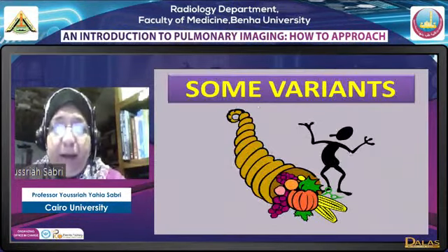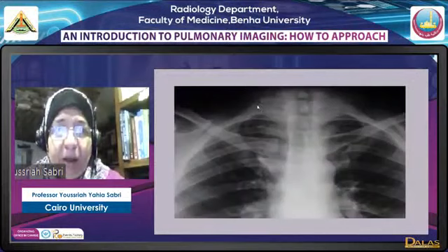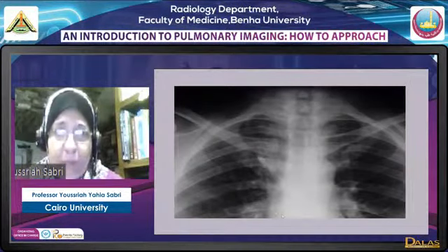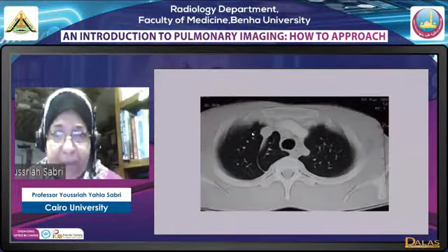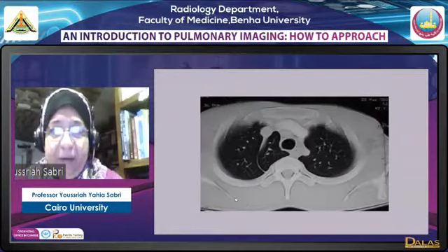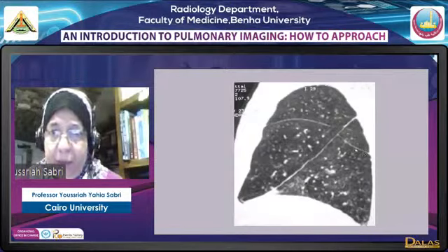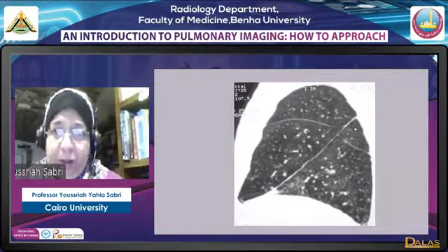بعد كده الفاريانت، ذا كومنست فاريانت اللي احنا بنلتقي بيه هو الازايجوس لوب فيشر زي ما حضراتكم بتشوفوه ده منظره في البلين فيلم وده منظره في السي تي. other uncommon variants ممكن بتتشاف في الريكونستراكتد ايمجز بالذات، ده السوبيريور اكسسوري فيشر كاكزامبل اللي هو بيفصل الميديا السوبيريور او الابيكال سيجمنت اوف لور من البيزل.